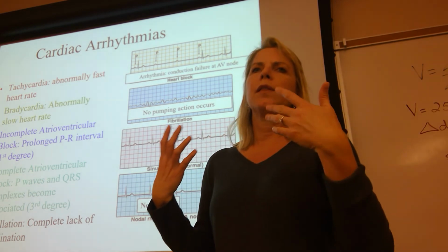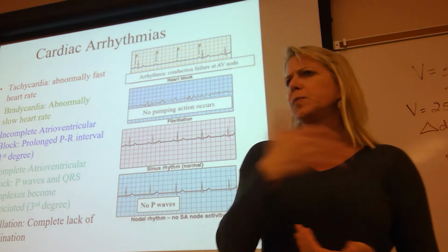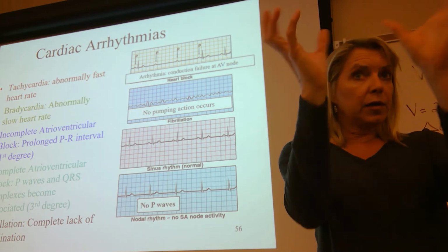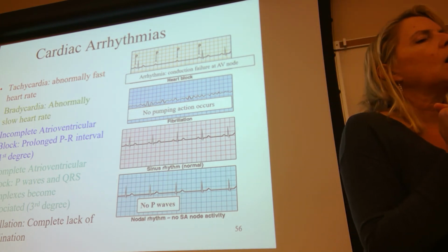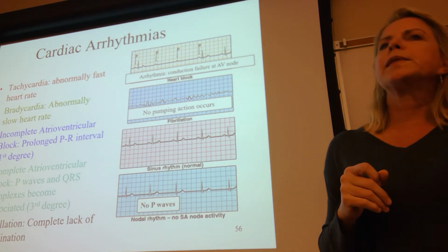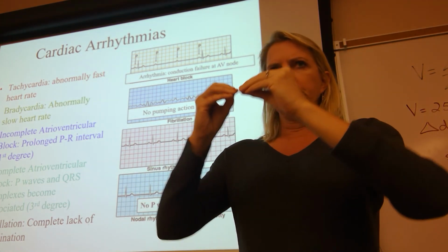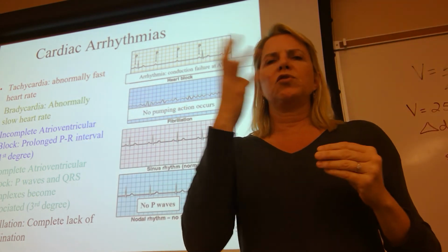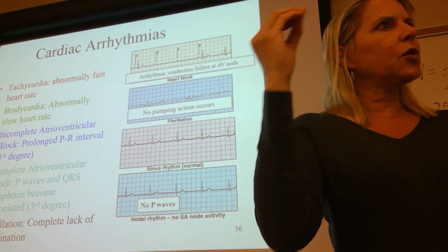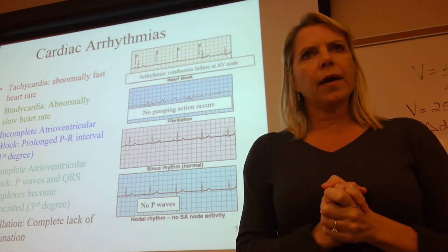And here's the other part of the answer. True, in a healthy person, the ventricular event does obscure the atrial repolarization electrical event. The machine is only going to pick up on the bigger one. But the reason why we don't pick up on it with third degree AV nodal block is because when the atria repolarize, there is such a small amount of current over a longer period of time that the machine does not detect it. That's the reason why. Okay?